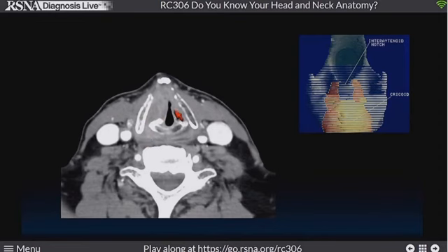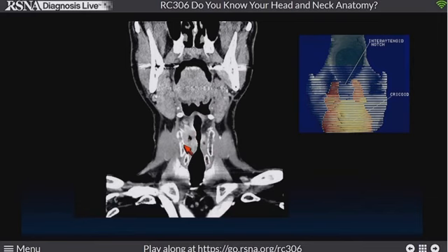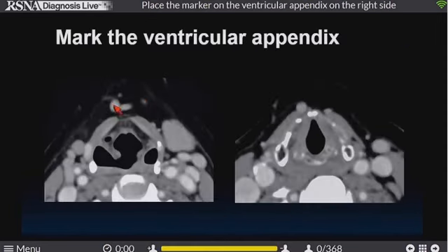We always will note the relationship or the level, again, based to the ventricle, based to thyroarytenoid muscle, and particularly looking for infiltration of the paraglottic space. Here you can see it looks very much like a lesion coming from the ventricle, but no, this was infiltration coming from the piriform sinus.